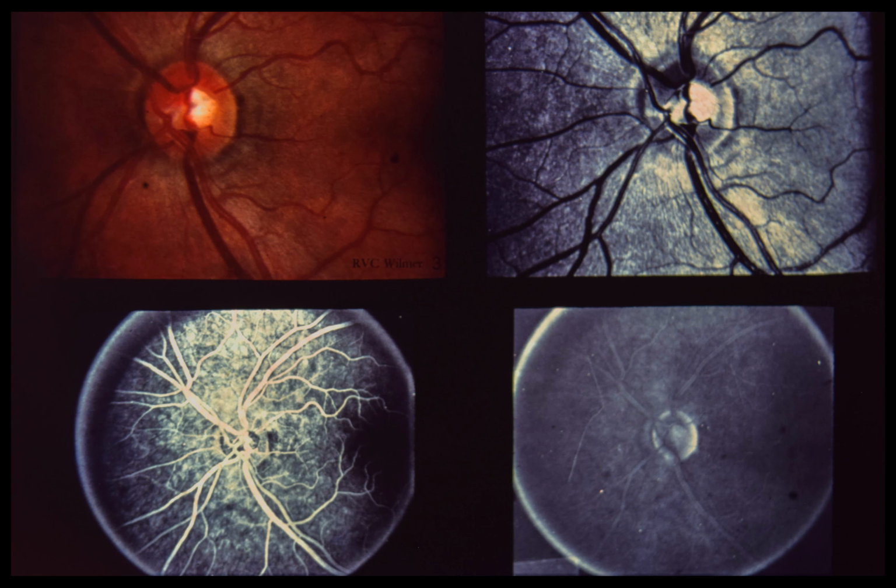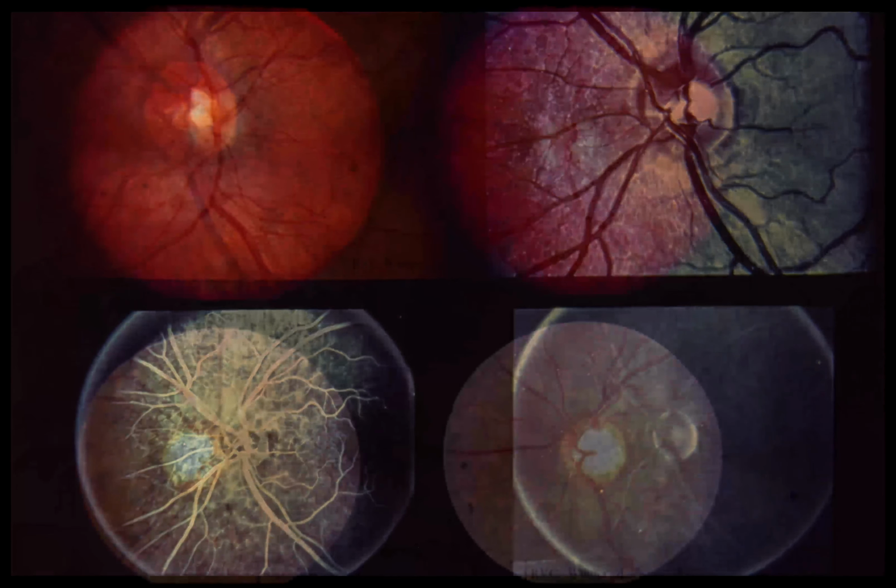Lower left. A fluorescein angiogram shows normal filling of retinal vessels and no leakage from disc capillaries. Since these superficial capillaries are branches of the central retinal artery, their endothelial cells have tight junctions that do not permit the passage of free fluorescein molecules. Lower right. A fluorescein angiogram shows late staining of the optic disc. This normal finding presumably results when fluorescein dye molecules from fenestrated peripapillary choroidal capillaries leak into optic disc tissue.